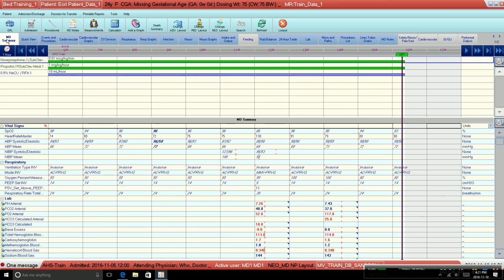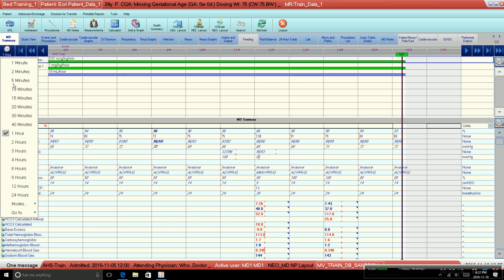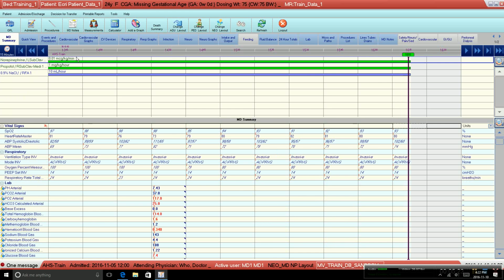starting to use it. Finally, the next line down is all of the time elements moving forward and backward in time, and also changing the resolution of the columns. As you can see along here, these columns are broken up into 1 hour increments, and you can change that by simply clicking the clock button here and then selecting how fine-grained you want your information to be.